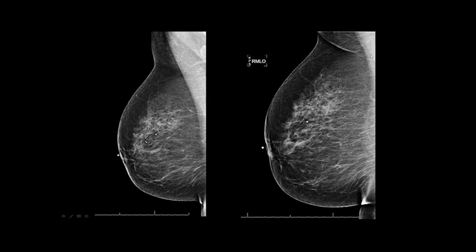Number one, they don't have enough muscle. It's not wide superiorly with the convex border. They're pushing up on the breast, so it's created a fold because they're trying to keep the breast up on the image because the paddle's too small. They do have IMF. There is an air gap here. The nipple's in profile. But there's a huge problem. The tail of the breast is cut off, and it's not a good image. The muscle is horrible. So the same patient done with a large paddle, you can see a huge difference.